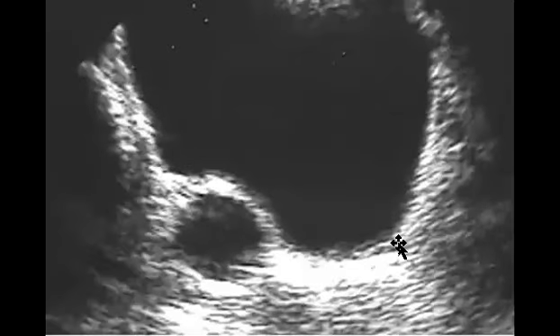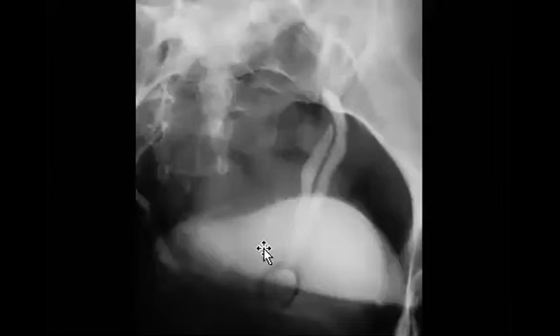This one is easy when you find like a cystic lesion. Maybe I let you describe. Nice. Perfect. Bladder within a bladder sign. Yes, ureterocele. And this is what is called cobra sign. So cobra head sign. So it is an easy one.